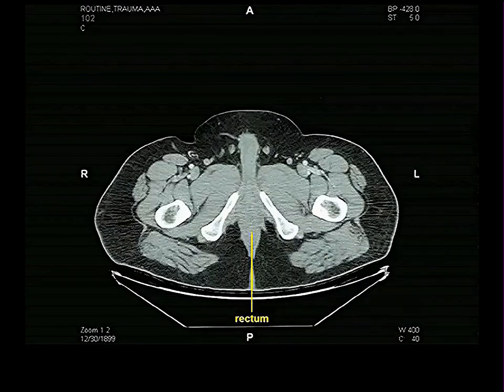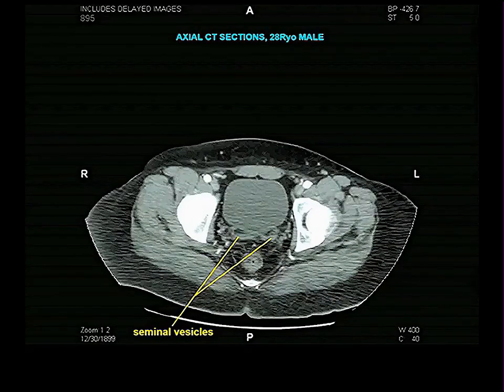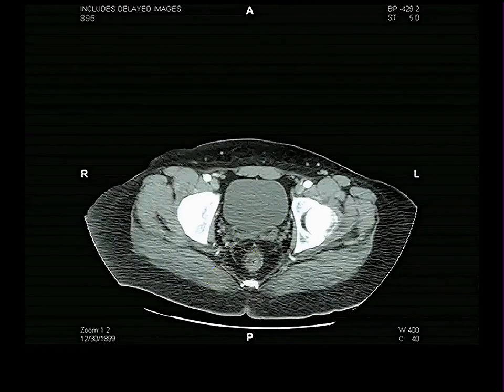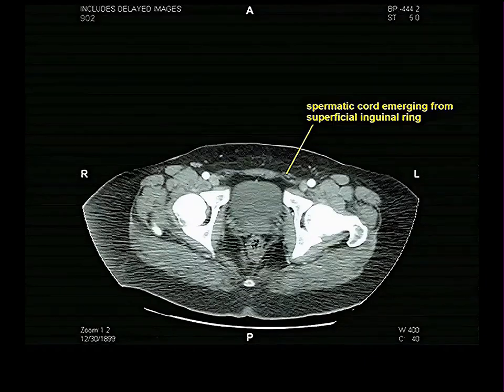And then we get further down, and I guess I don't show these things. Oh, I'll show them later, the male fanciness on the outside. Here are two seminal vesicles that look like a pretty crappy bow tie, right? Because not everything looks as beautiful as you would want it to look. But they're sitting as two nondescript things between the bladder and the rectum, so they must be seminal vesicles. We'll continue further down. Prostate's going to show up here.